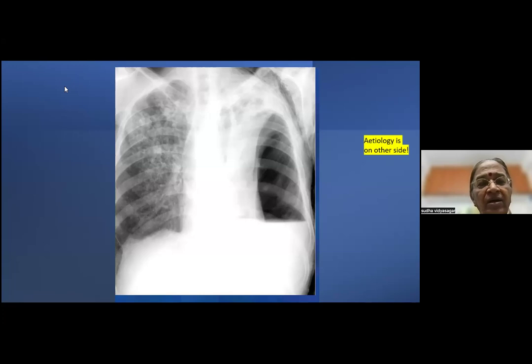Okay, somebody called it left pneumothorax. Left hydropneumothorax. Okay, that's better because we got a line here. Better we call it a hydropneumothorax, because pneumothorax never has a line. So there is a line here. It's a hydropneumothorax. Okay, whatever it may be.